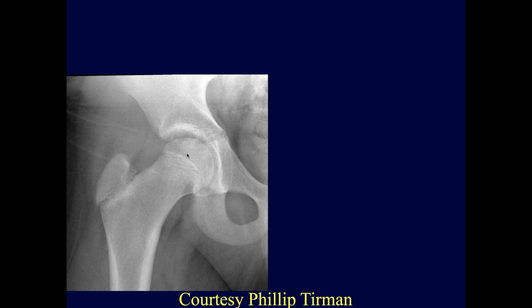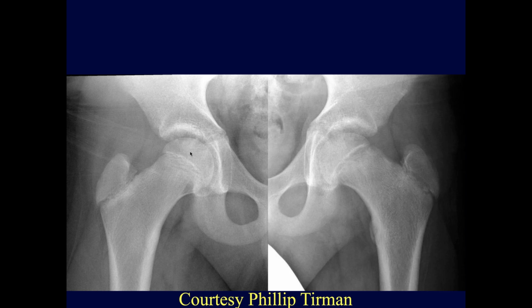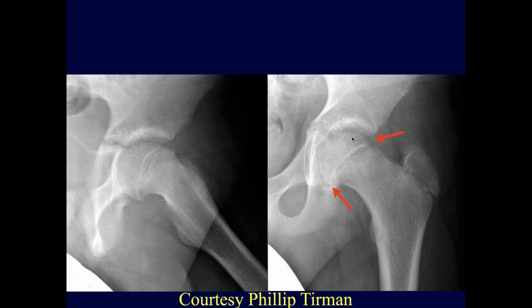Ashu, what do you think of this one? Right hip pain. On this single view, pediatric patient, I don't really see much abnormal here. The epiphysis, this head looks kind of abnormal. Almost looks like the femoral head. This could be SCFE, a slipped capital femoral epiphysis, where the femoral head is kind of slipping down inferiorly. Yep. Very good.